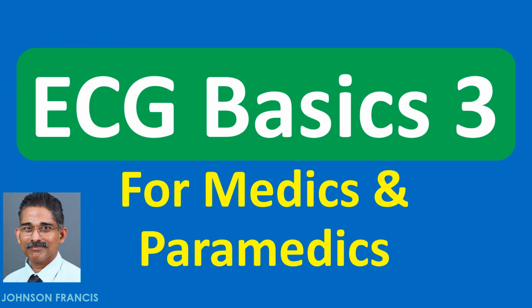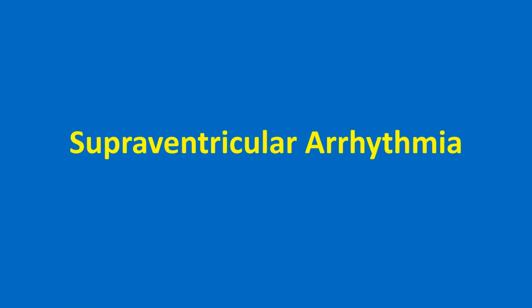Third lecture in the series on basic electrocardiography. We will start off with supraventricular arrhythmias.